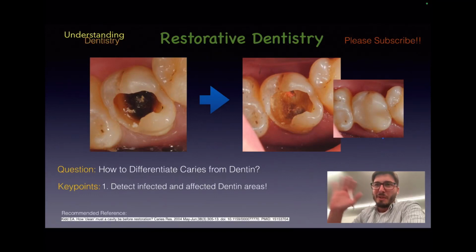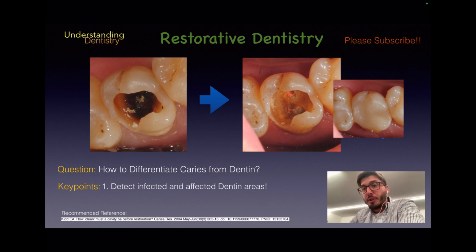Hello guys, and welcome to this video to talk about one of the most common questions from you guys, which is how to differentiate caries from the remaining dentin, okay? And you guys keep sending us this question, especially to the tutors of restorative dentistry participating in this channel. And we have selected now 3 main key points to help you guys answering this question, okay?